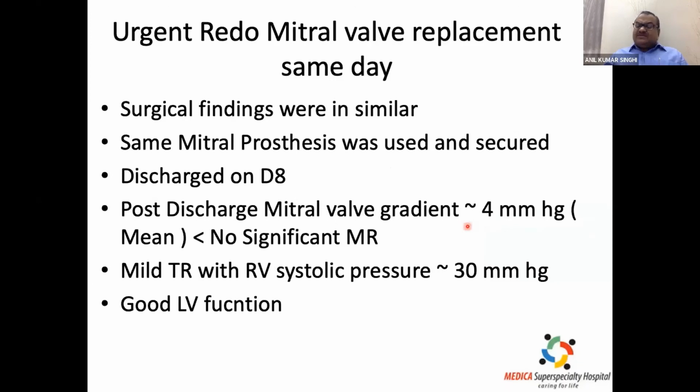So the patient was sent for surgery from the table, and that was the game changer of a detailed evaluation by transesophageal, especially 3-dimensional echo. Even 2-dimensional was not giving that perspective. It is very difficult for the surgeons to accept the patient from the OPD to the surgery unless they are convinced that this is a dire emergency.